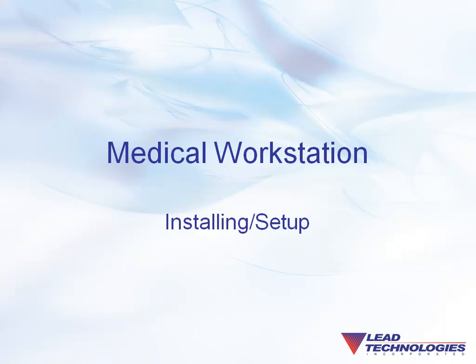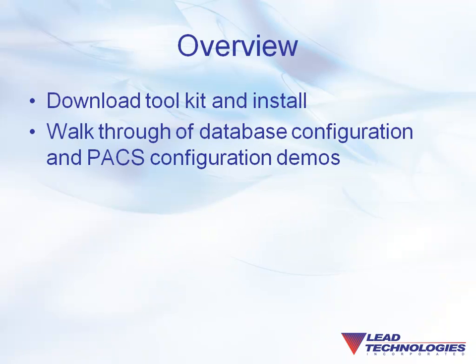In this video, I will show you how to download and install our Medical Workstation demo. I will first show you from where to download the installer and briefly touch on the installation. I will then perform a walkthrough of the database configuration and the PACS configuration demos. Once you've completed the steps from this video, you will be able to work with the Medical Workstation demo.